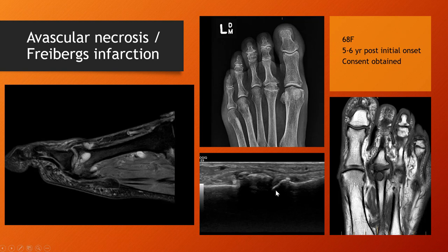This is the dorsal sagittal ultrasound, and we can see that necrotic tissue has now been replaced by bone. There's complete destruction and collapse of the joint space in the second toe and subcortical cysts, and you can see all this soft tissue protruding into the web spaces. In a case like this, it's obviously going to be very difficult to examine the web space because the periostitis, or the stress reaction, is causing a significant swelling adjacent to the joint.